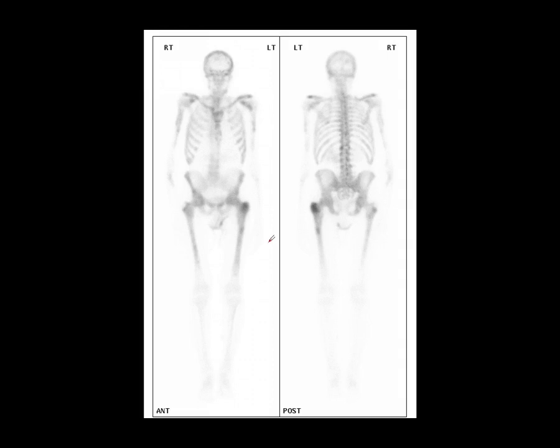So just be careful that you always think about it, especially if you're dealing with a patient who's got a very abnormal CT scan, grossly elevated PSA. Just look carefully and ask yourself, do they have a superscan, and is it that the entire bone is actually abnormal? Looking for the kidneys is very helpful.